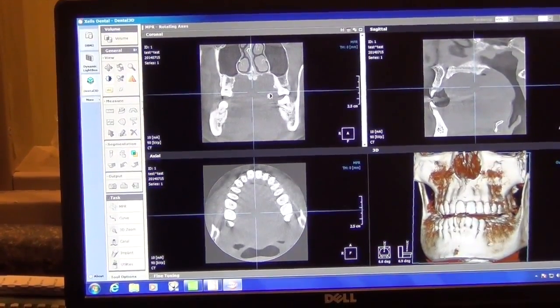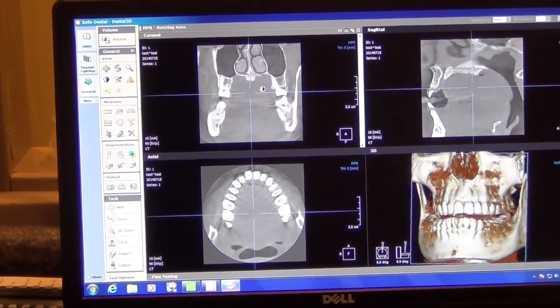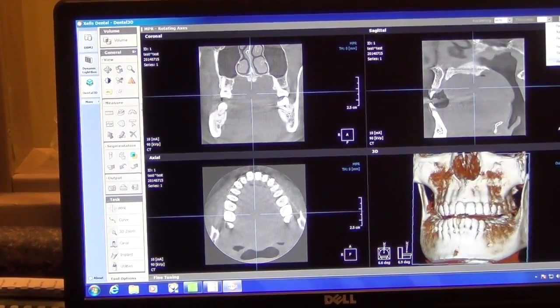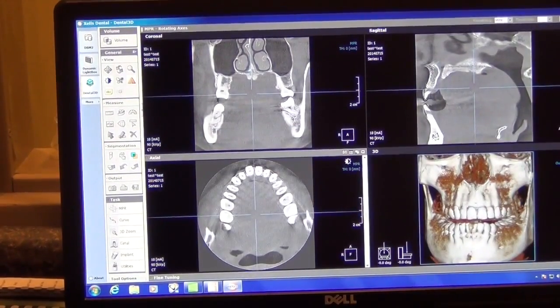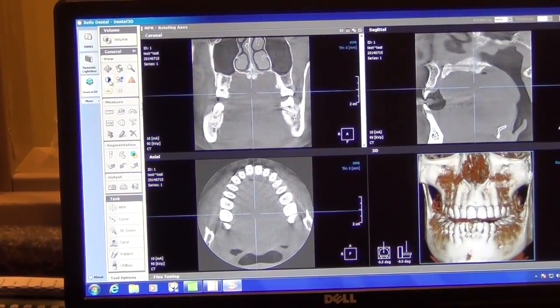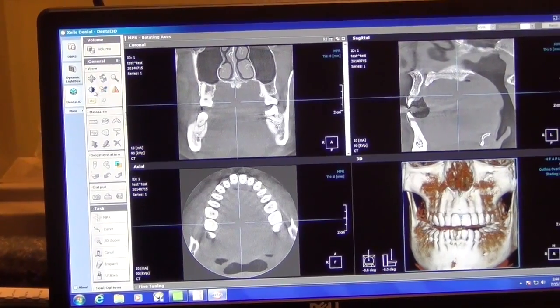And at any time, if any of the options that we've manipulated or changed on the image, if I move my mouse to the top right corner of the window, I can choose reset. I can always go back to reset all, and it brings the data right back to its original state as it was shown when we came into the image. Okay, let's do that again because that might be something I might be doing a lot of.